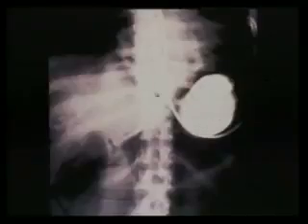Here, there's an NG tube of some sort, contrast in the gastric fundus. Do you see anything abnormal? Excellent. There is lucency in here. Some people could say, well, that might be the duodenum, but look at this. This is an organ, and this is air in the wall of the organ.